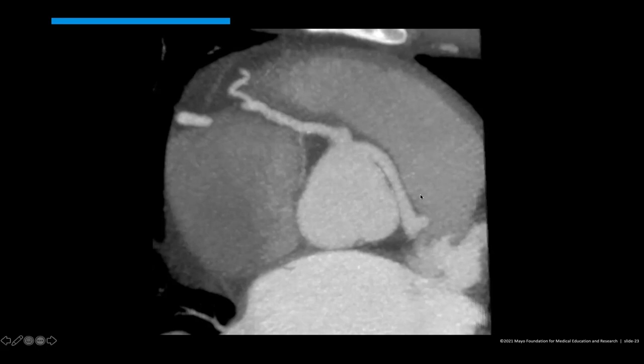So this would be the pulmonary artery right here. If this is the right ventricular, pre-pulmonic, sorry. So the sternum is up here, RVOT, pulmonary artery. This vessel is not going in front of the pulmonary artery, like we saw in the earlier case. It's going right between the aortic root and the main pulmonary artery. Okay, so interarterial course. Yeah, this is another interarterial course.